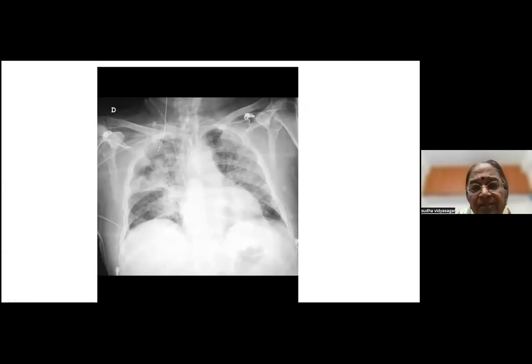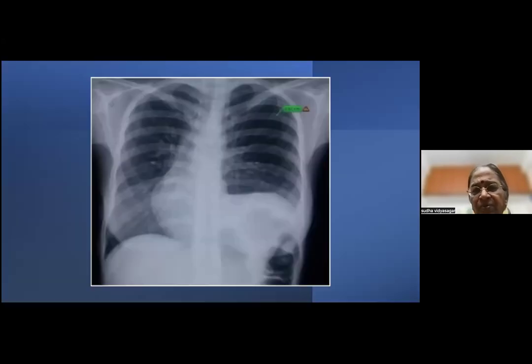That's an ICU X-ray. The patient is intubated. You can see the intubation tube here. And there are multiple small consolidations everywhere. This patient would probably be in ARDS. But ARDS is not a disease. It's a syndrome. It could be aspiration. It could be anything. It could be sepsis, septic shock with ARDS, or pneumonia. All these are possible. Okay.